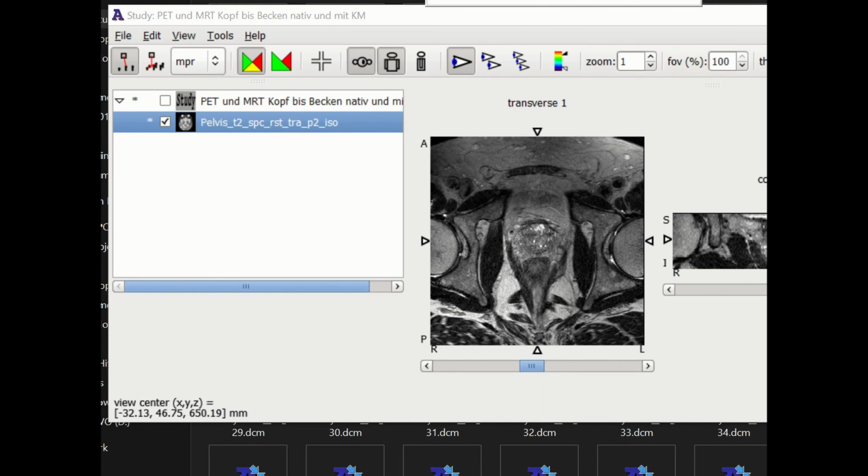Mainly, the segmentations that we get are basically a percentage of probability of how likely a pixel is to be part of the ROI of the segmentation. Basically, if it's more than 50%, we're going to say it is part of the segmentation, and if it's less, we're going to say it is not. That's the most normal approach, but you can select whichever percentage that you find appropriate.